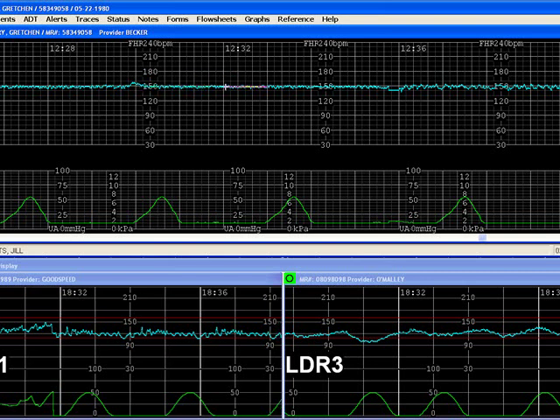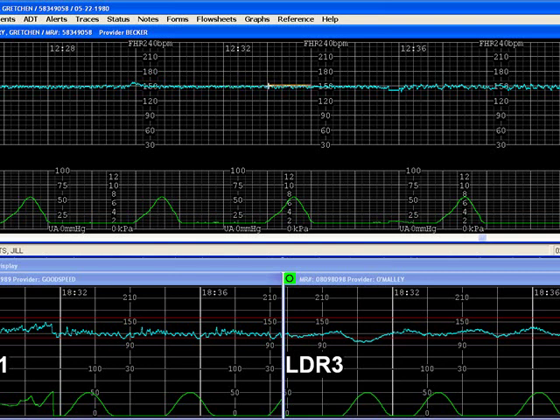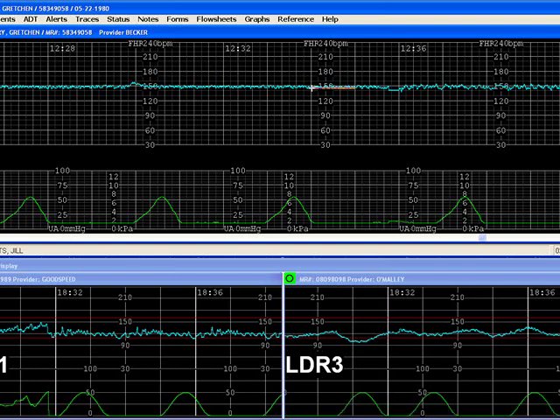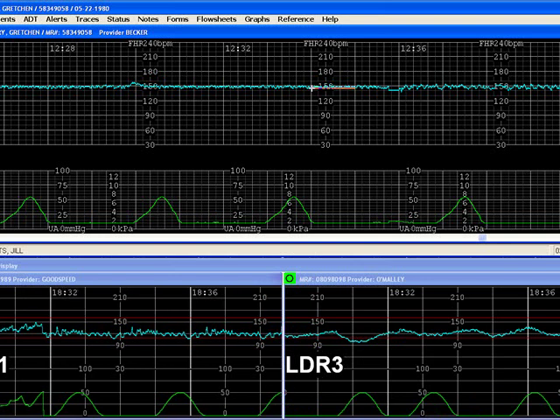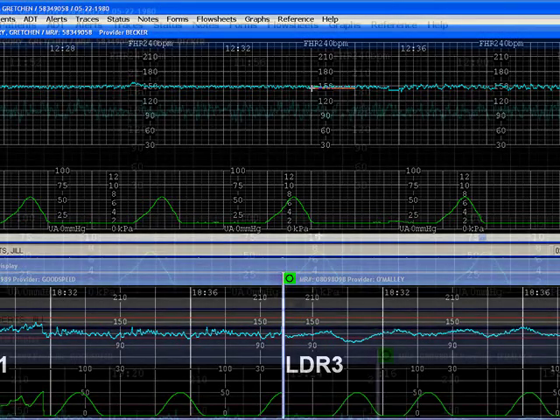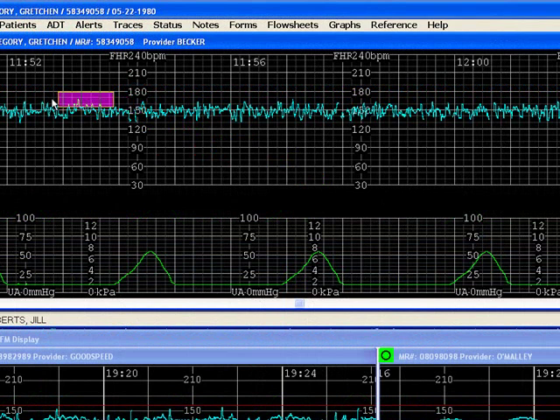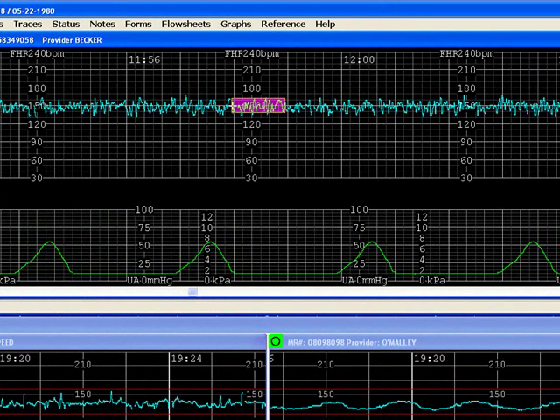If the variability exceeds the 5-beat box for the majority of the baseline, the variability is greater than minimal, and the clinician should use the 25 beat per minute tool as the next step to determine whether variability is moderate or marked. The 25 beat variability tool also measures 1 minute in length, but the height is equivalent to 25 beats. If the fetal heart rate variability exceeds 5 beats, but fits within the 25 beat tool when hovered over the baseline, baseline variability is moderate.